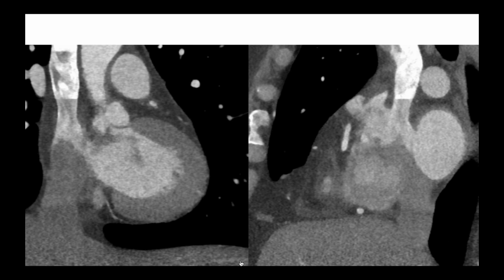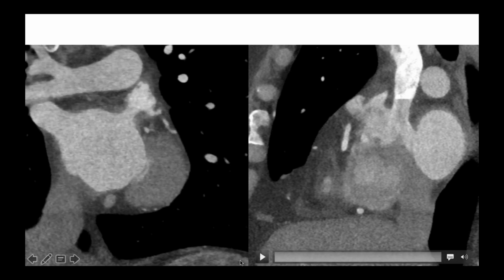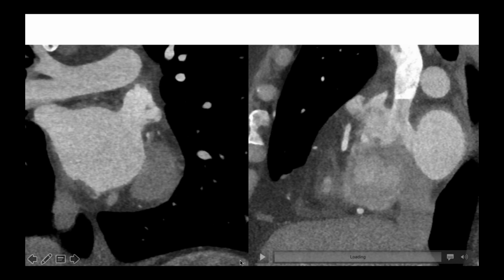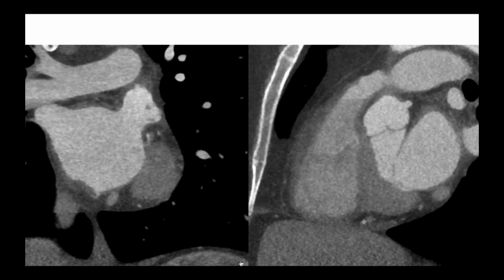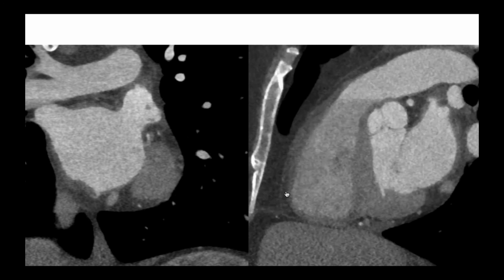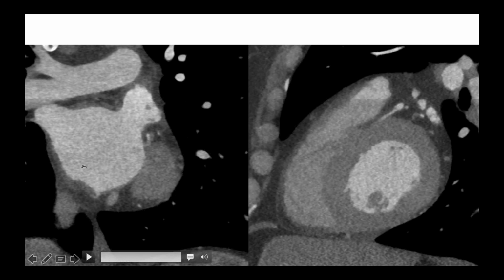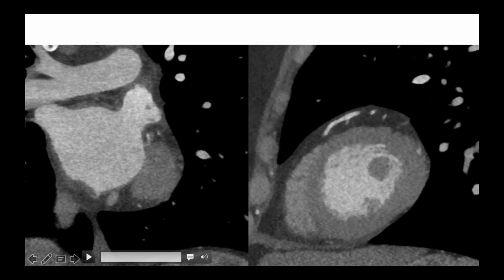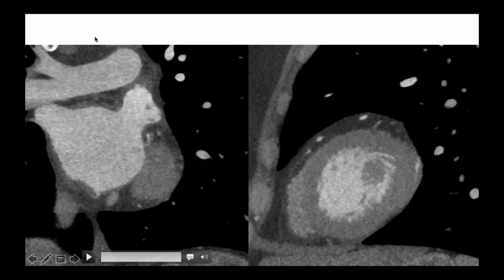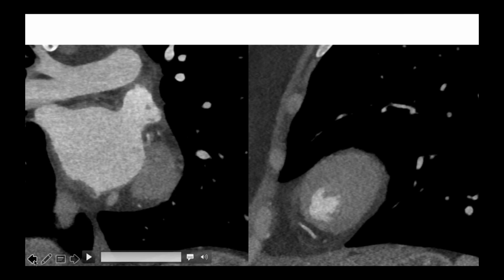Hey, Carol. Prachi here. Nice case. I was wondering about spontaneous coronary artery dissection here. Yeah, that's a really good thought. Anything pointing towards that? How did you deduce that? Because that's what it is. I saw that just given the very smoothly defined area that wasn't enhancing.